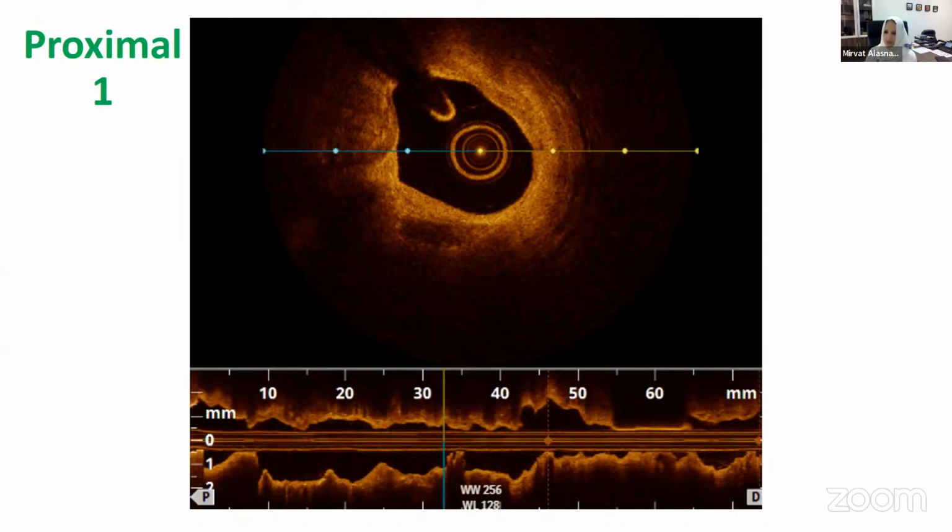The difficulty with very tight lesions like the one that I just showed you is sometimes you need something else first to be able to deliver the lithotripsy and to be able to deliver a cutting balloon. So sometimes the order in which you do it is very different. I don't think there's a definite science for it right now, but I think what seems to work most is combination therapies for calcified lesions.